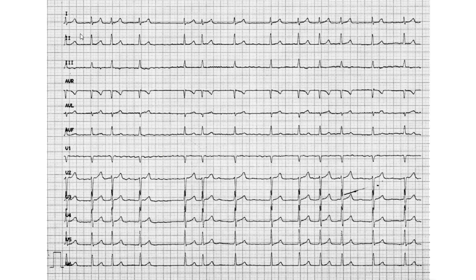Point 3, heart rate: 1, 2, 3, 4, 5, 6, 7, 8, 9, 10, 11, 12, 13 by 6. I keep calculating 78, so it's normal. Point 4, fibrillation. This is clearly fibrillation, and we calculate the peaks. We're going to skip that. Point 5, PQ interval.